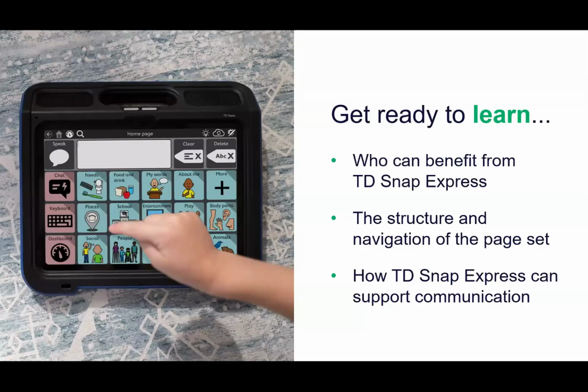So by the end of this demo, you will be able to describe who can benefit from TD Snap Express. You will understand its structure and navigation, and you'll be able to identify features that support communication.